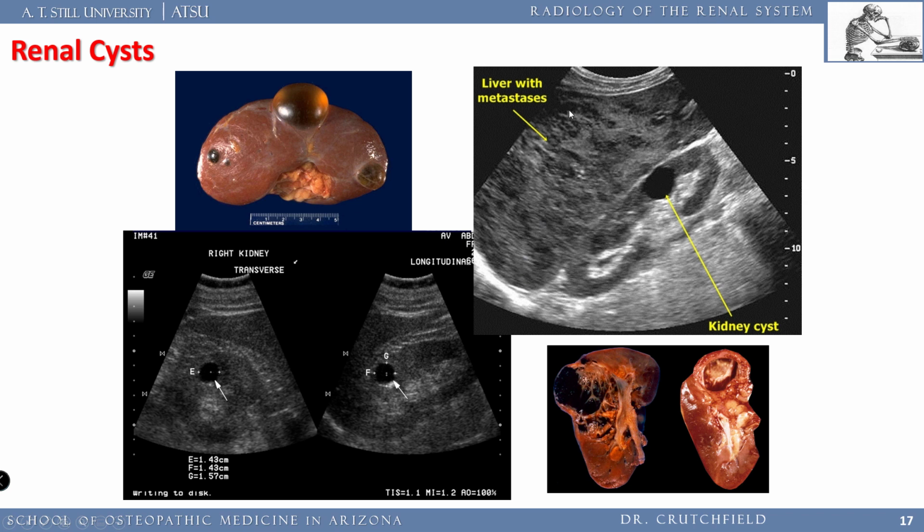Here on the ultrasound, check out what we can see. This is the liver, and it's got multiple lesions within it. This is not healthy. These are not cysts. These look like solid masses within the liver. Here's the right kidney, and here's a cyst on that kidney. We call this area between the kidney and the undersurface of the liver Morrison's pouch. Morrison's pouch, right in there.